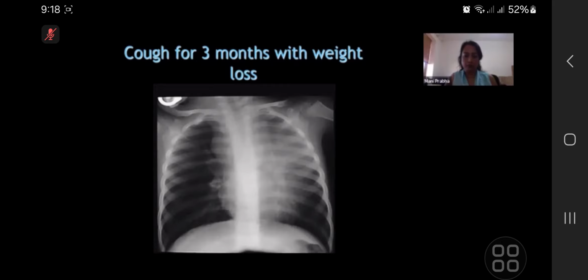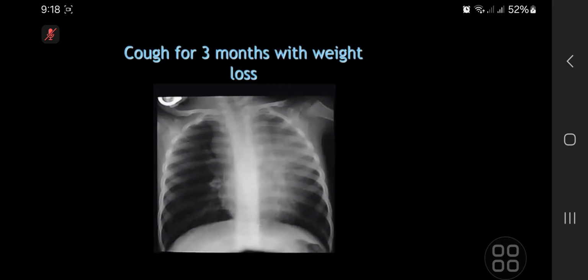My first thought is, could it be infection, like a pneumonia? But with a history of weight loss, I'm thinking malignancy, but I can't think of anything pertaining to the lung that would give this appearance. The thymic contour is normal.